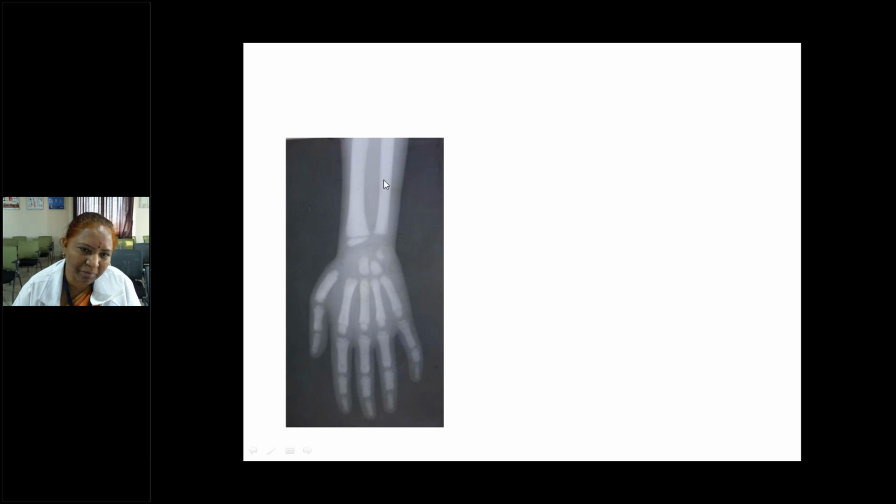showing 3 carpal bones. But what about the bones? There are no fractures. But what about these bones? Is it normal? Increased bone density. It looks like floor marble, a marble bone appearance. Can you observe this difference? No trabeculations, very dense bones.